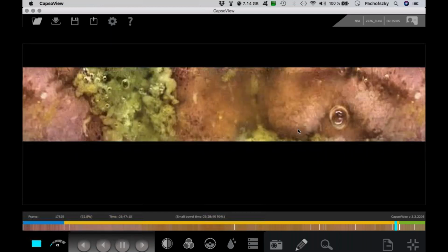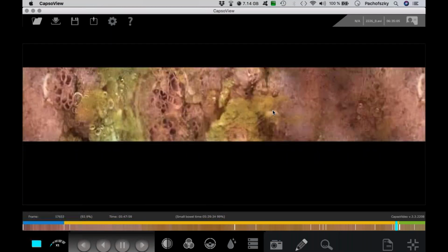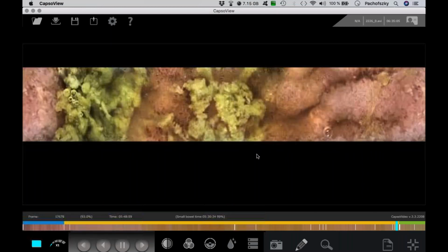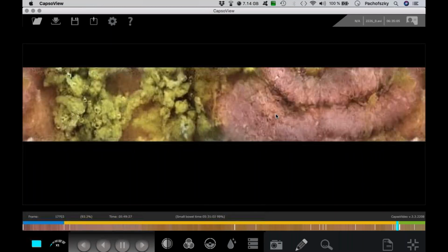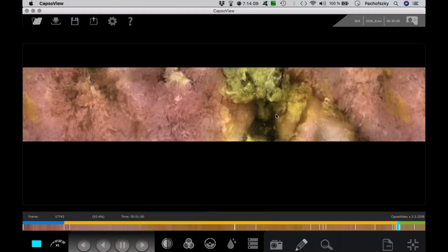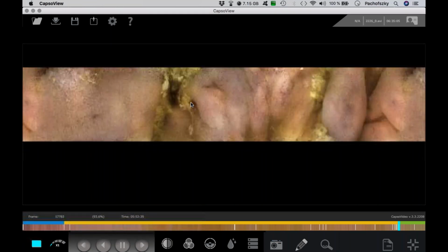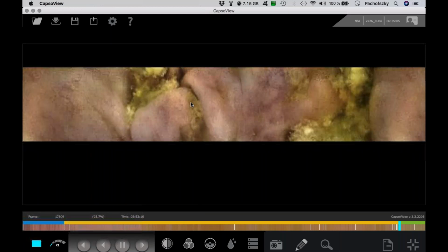So with capsule endoscopy, you can't name the disease only by the pictures. You have to know the history of the patient. You have to know some details. You can only say or describe what you're seeing. You can say we have some ulcers, some lesions, we have inflammation, but you can't give a diagnosis because it can be looking like NSAID enteropathy, like a Crohn's disease.